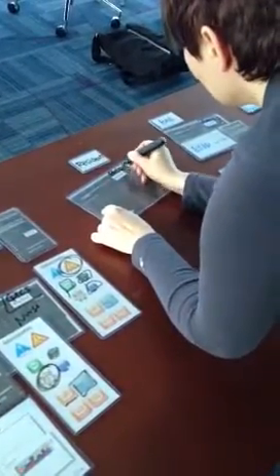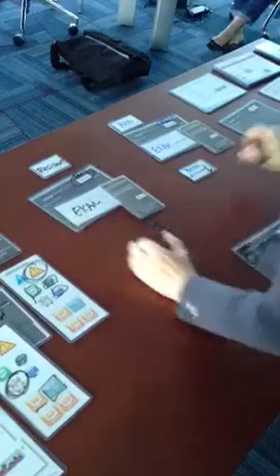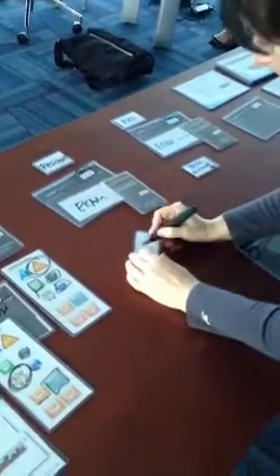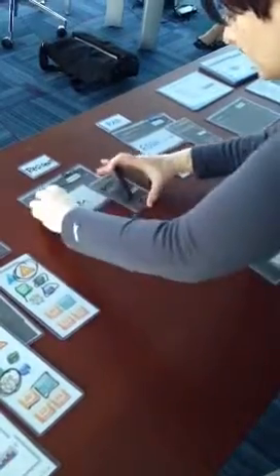We could put a resident in this process, and when they're in their PACS workstation, their PACS work list, they launch an exam. They go through the same process that the radiologist would have. It pops up a panel. Let's say they say, I agree, there's no discrepancy, we're good here.